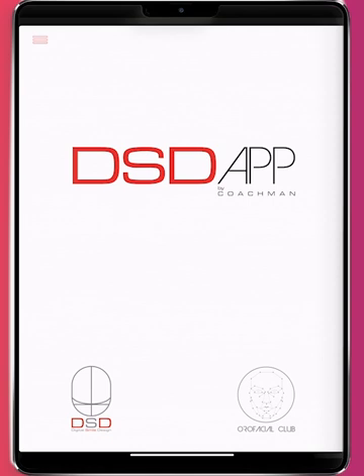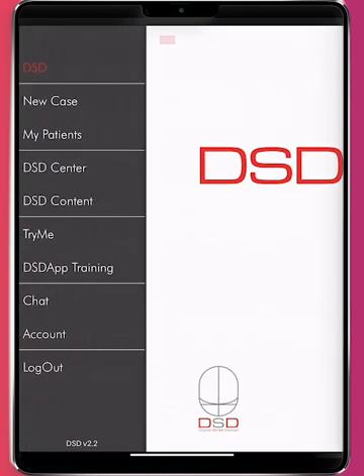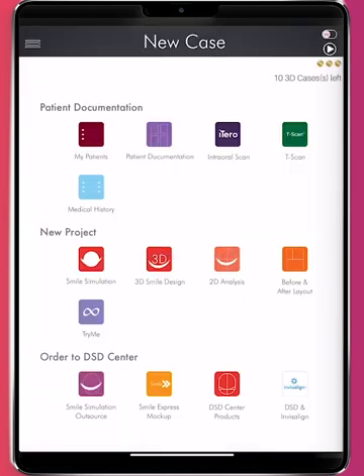My name is Ralph George and I'm going to explain to you the first steps using the app and how to maximize the experience with the patient. Top left we have a menu. New case. The screen is divided in three sections: patient documentation, new project, and orders to the DSD center. You use the patient documentation to create the digital patient. I'm going to explain more in a bit.